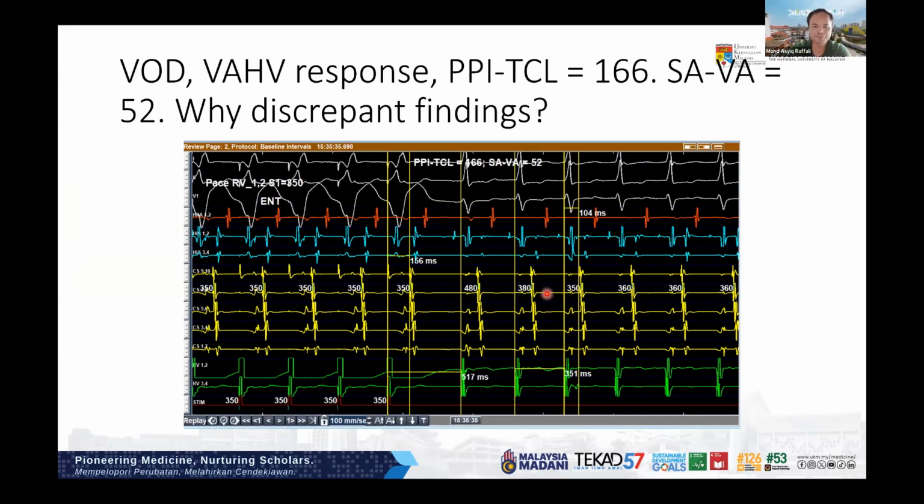Okay. But if you look at your proximal A during the V pacing, it has a much higher amplitude. Can you see that? Yes. Now pacing got smaller. Yes. But the vector polarity reversal is the same. What I mean is part of that went through the septum.